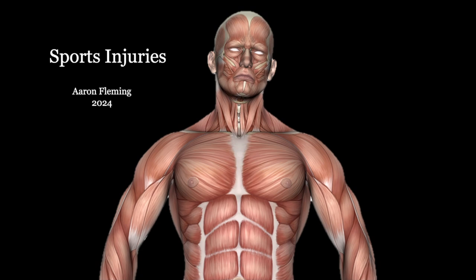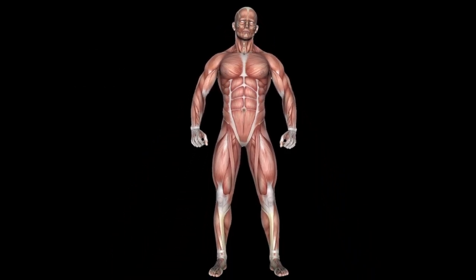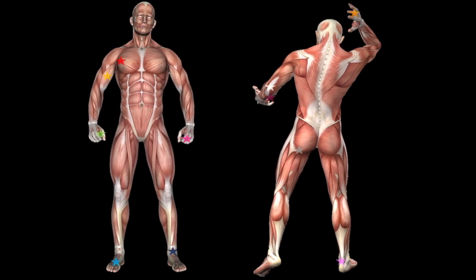Sports injuries are inevitable and unavoidable. Some injuries are very mild, whilst others are much more significant with potential surgical implications. The following are a collection of some of those injuries. We'll look at how they happen, what they look like on ultrasound, and what they mean in real terms.